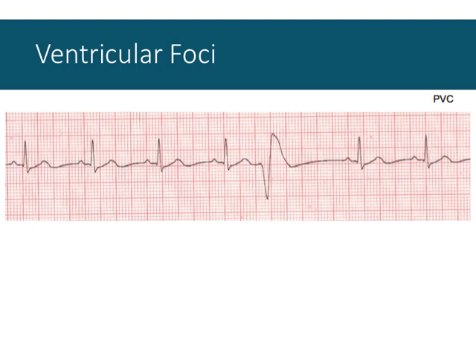We have P waves, QRS complexes, and T waves all in a normal rhythm and order. The durations are appropriate, but for some reason, the ventricular foci here activate, and we see this large spasming of the ventricles that is eventually reset.